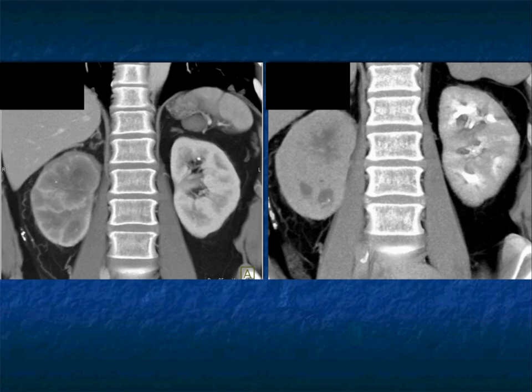You could think about strange infections, though. Pyelonephritis, you would see stranding around the kidney. You don't see any stranding. The kidney would be larger if you had such bad pyelonephritis that there was no function. Renal infarction, if you had a patient with a renal vein thrombosis, but then you do get some cortical medullary differentiation, or you get some perfusion in the periphery of the kidney.